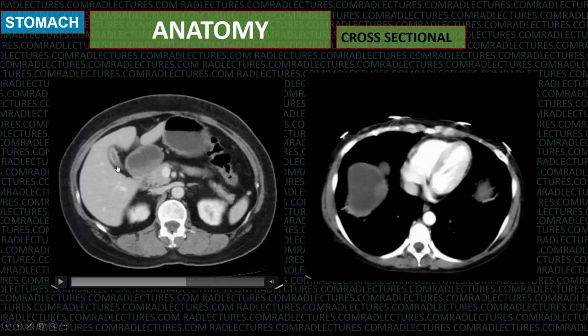This again is a very important anatomic relationship, because one is that the diseases of the gallbladder can cause changes in the region of the distal antrum. And second thing is that when you are looking for the pyloric channel in patients with hypertrophic pyloric stenosis, identifying the gallbladder first goes a long way in helping you.